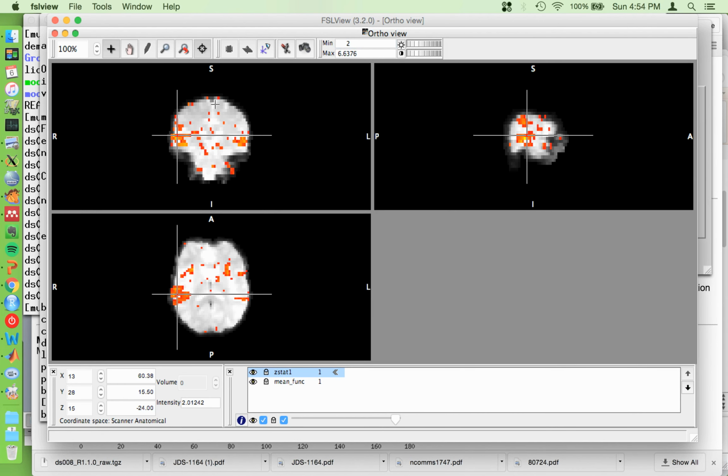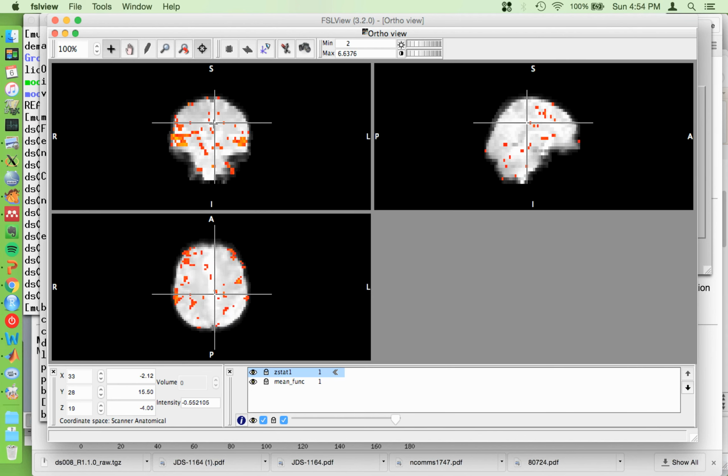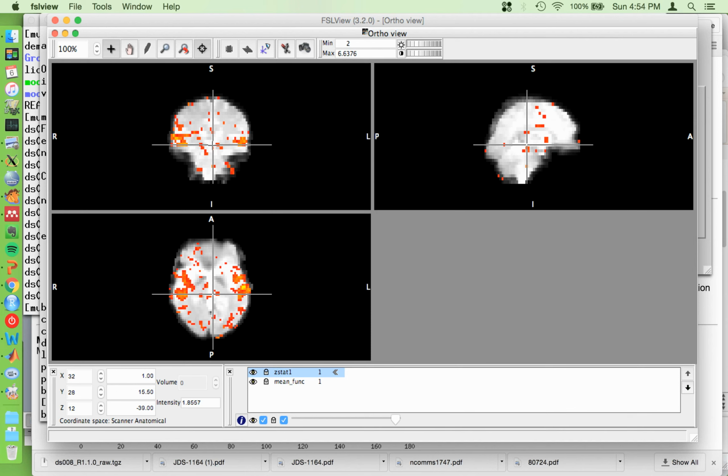Woo! I don't even know. I'm not going to begin to pretend I know brain anatomy. But anyway, if you need some sort of activation reality check at this step, this is how you do it. No need to run correction.